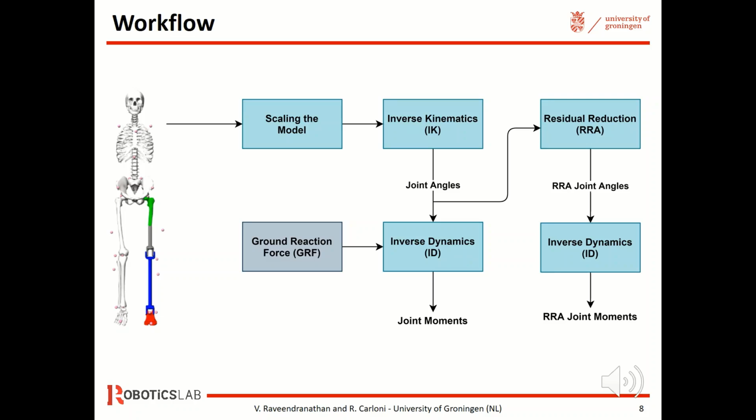For all bony prominent markers, respective marker pairs have been used to scale each segment of the body. For instance, lateral knee and ankle markers have been used to scale the tibia of the subject. Such practice helped in efficiently reducing the scaling errors.